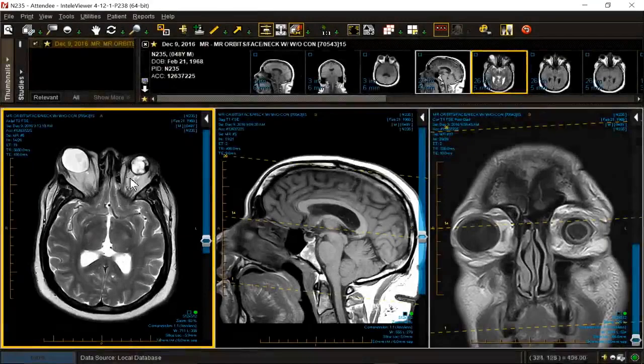It's a patient with laboratory proven, diagnostically proven, and unfortunately lost his left eye from Graves' disease. Another example of Graves' disease. And you might be wondering, why does this globe look so funny? Why is it so irregular in the back, like it's stretched out? That's called a staphyloma.